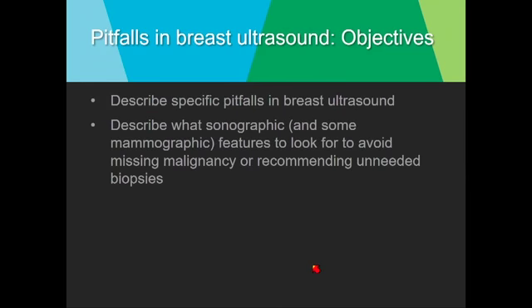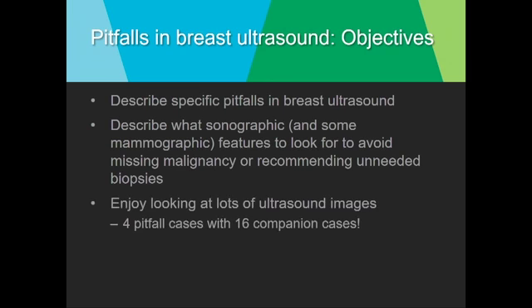I'm going to be talking about pitfalls in breast ultrasound today, and these are my objectives for this talk. I hope by the end of it, you will be able to describe some specific pitfalls in breast ultrasound, as well as what to look for sonographically, and a few mammographic features to avoid either missing malignancy or recommending unneeded biopsies. I also hope that you just enjoy looking at lots of good, hopefully, ultrasound cases.